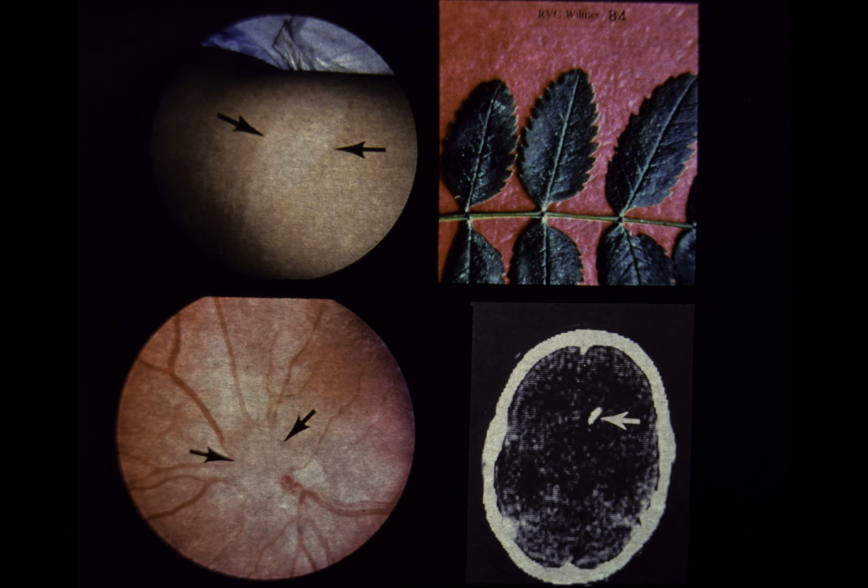Lower left. Above the right optic disc is a well-circumscribed, elevated lesion that obscures the retinal vessels. Lower right. An EMI demonstrates a single calcified lesion that appears to be located in the wall of the right lateral ventricle. These calcified subependymal nodules apparently originate from giant cell astrocytes. They are benign, but may be responsible for seizures and may even obstruct circulation of cerebrospinal fluid, resulting in increased intracranial pressure and papilledema.